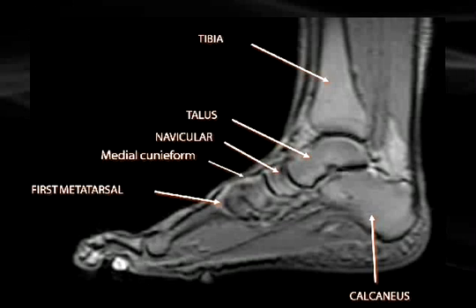You can see that this person does have a little bit of what would be called a hammer toe, where that metatarsophalangeal joint has been extended on the dorsum of the foot, so it's dorsiflexed, whereas the distal components of the toe are plantar flexed. That will form a hammer toe. Just to identify a few things, we have a nice view of the talus and the calcaneus, all these midfoot structures, and the first metatarsal, medial cuneiform, and then, of course, coming down into the phalanges.